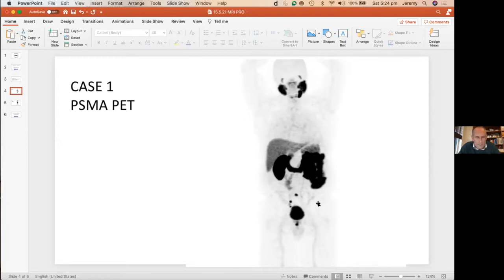And so he went on to have stereotactic radiotherapy to those nodes and has required hormone therapy as well, unfortunately. But I guess it just shows you that, had I actually gone to biopsy 6 months earlier, would there have been a difference? We'll never know. But if I had done a PSMA PET at the outset, then I might have done a biopsy right at the upfront. So Lisa, have you got any comments on that?